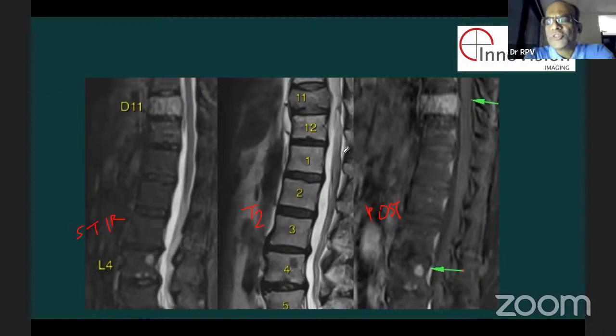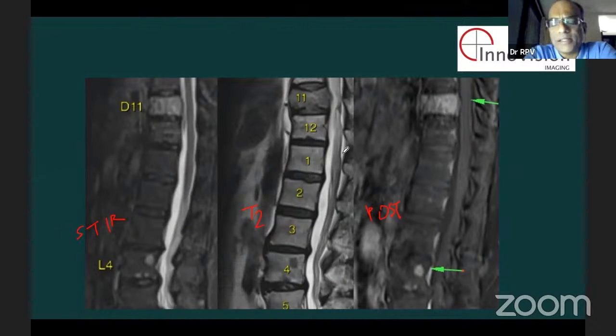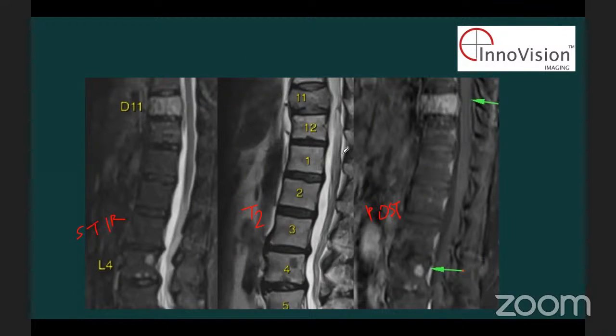So Harshit, what would you start thinking here? What would be a question that runs through your mind? I guess there are two things, correct? Do you want to think it's an osteoporotic fracture? Or would you want to think that it's got a pathology associated? So metabolic or pathological? That would run through your mind, isn't it? Yes, sir.